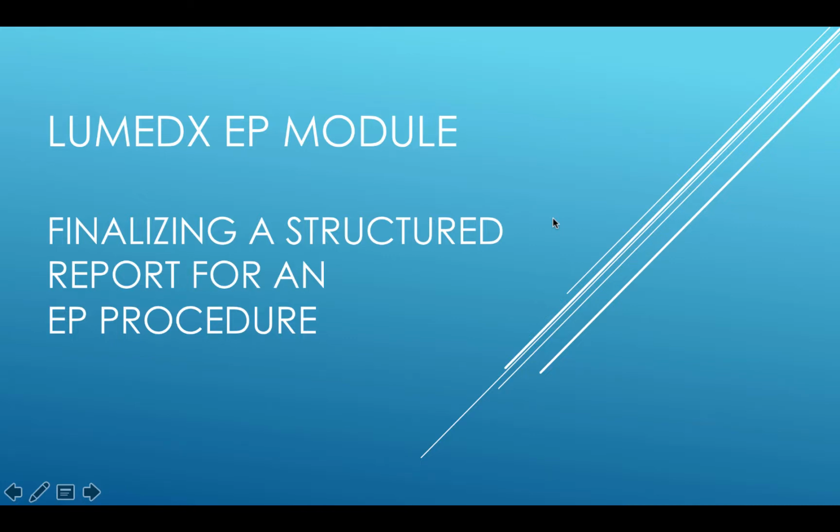Lumedx EP Module, Finalizing a Structured Report for an EP Procedure.